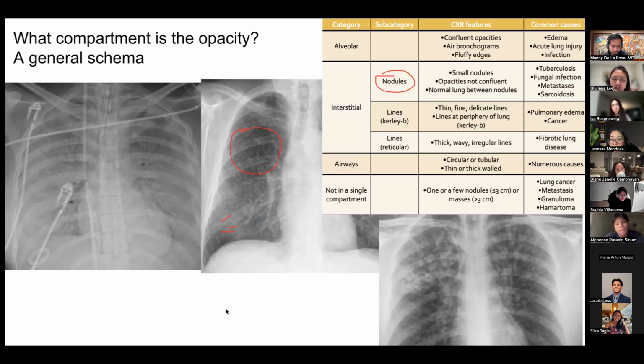And then finally, just down here, you can see that there are some very obvious looking circles, right? This one doesn't have the best examples, but you can also see some stand-up lines. What we're looking at here is a disease in the airways. The reason that we're seeing circles and lines is because your airways in the lungs are shaped kind of like tubes.